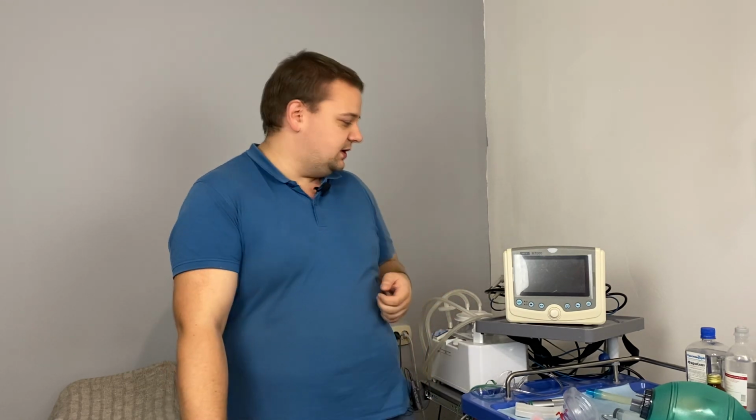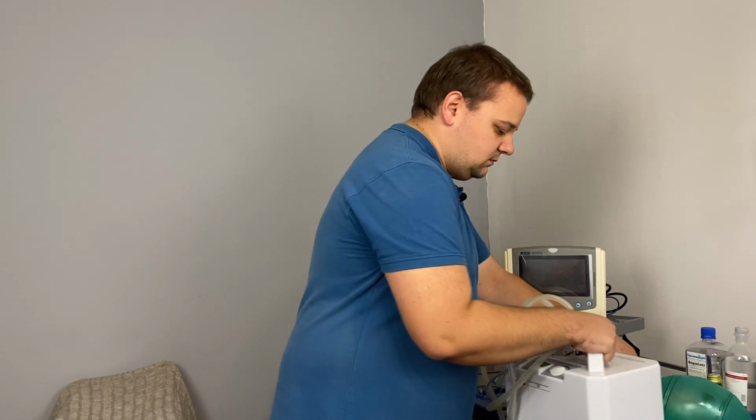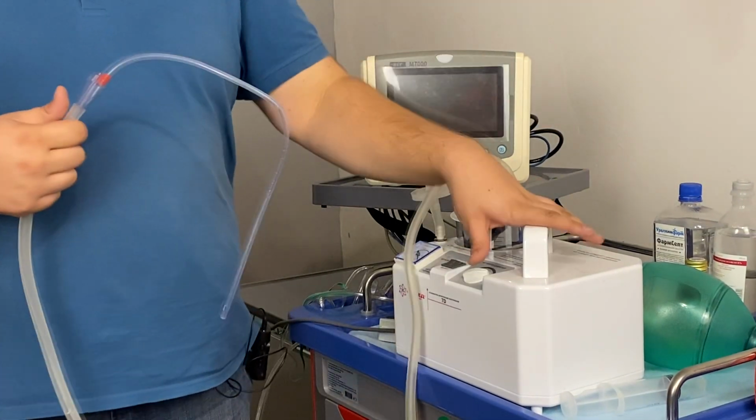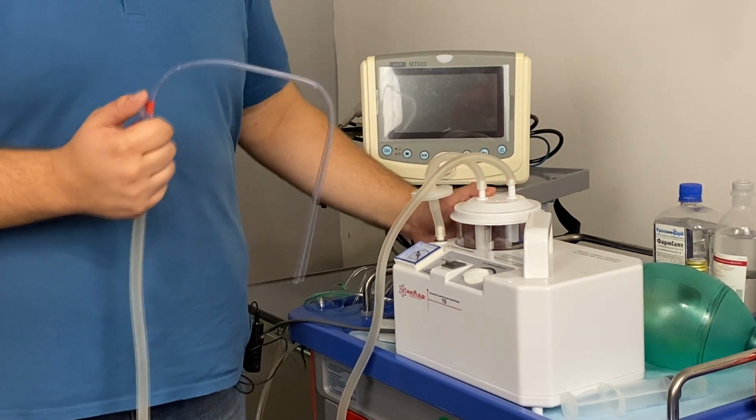And also, when we're speaking about airway management, we have to discuss the aspiration devices. When we see something, generally some liquids inside the patient, maybe blood, saliva, foam, or vomiting masses, or a mixture of those listed above, in this case we have to clean it up. And to clean up the liquids, we have the aspiration devices. They may be manual, driven by hands or by foot, or we can use the electric ones. Here is an example of an electric aspiration pump. Of course, there are many models, but usually this is the compressor. Here it turns on. They have a bowl to collect all the stuff that we get out of the patient.